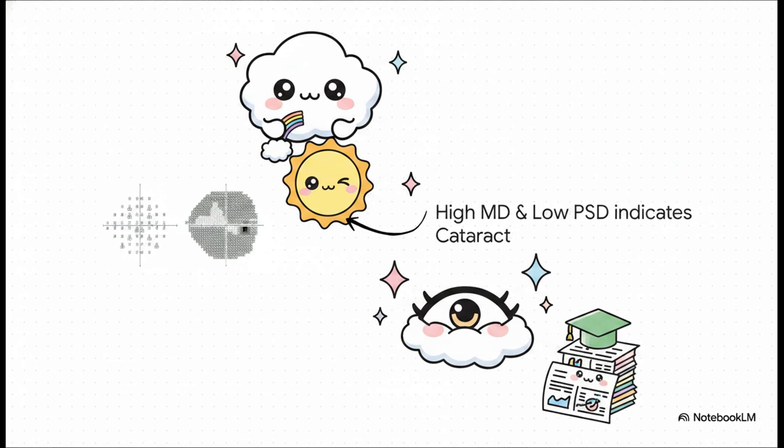As a final thought, always remember the learning effect. A patient's visual field often magically improves on their second or third attempt simply because they learn how to do the test better. But true glaucoma doesn't magically cure itself on repeat tests. If the defect goes away, it was never glaucoma in the first place. Use these 5 steps, trust the probability data over the grayscale shadows, and you'll never be fooled in clinic again. So the next time you're handed a terrifying wall of numbers, will you be ready to crack the case?